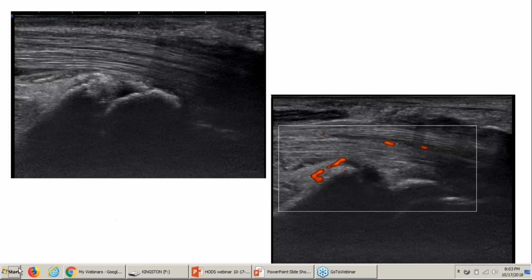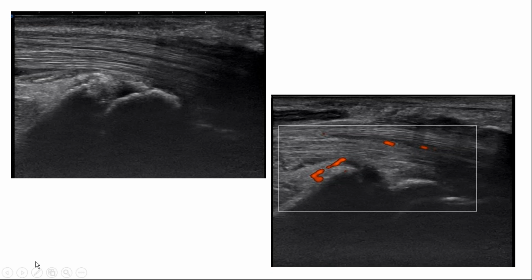In the tendons, there is no significant hypoechoic signal. However, there is a positive color signal on color Doppler, which is positive for vascularity in the tendons. So this is again suggestive of some type of inflammatory or early tenosynovitis of the tendons. This is inflammation, because you see vascular changes all around. Some type of new angiogenesis is going on. So yeah, you would say something like that.